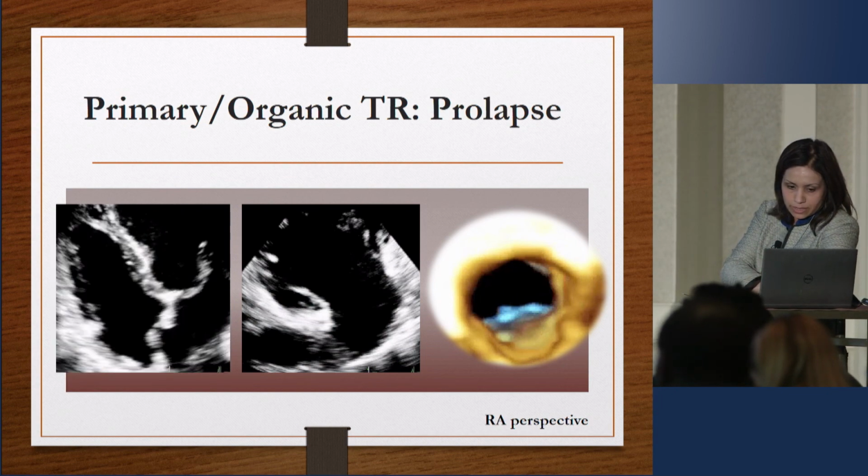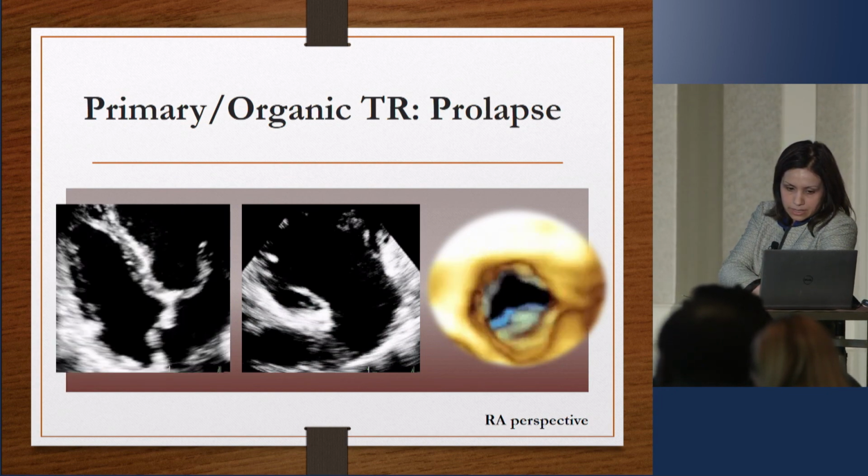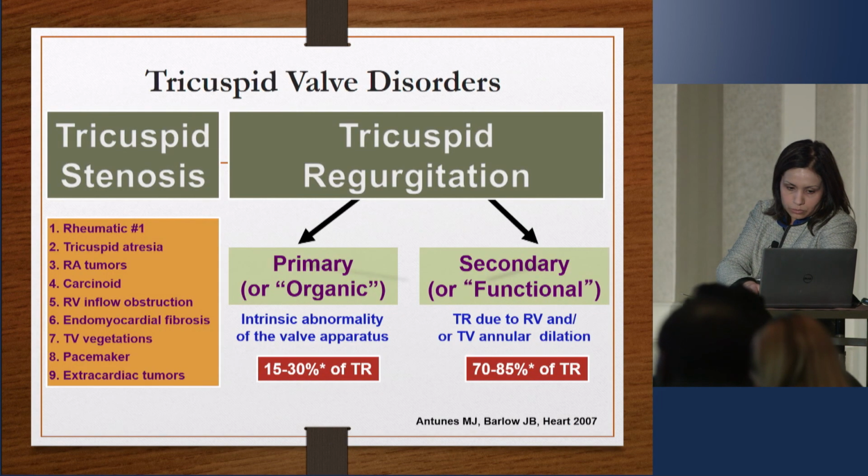This is an example of a case. Maybe I'll go back and forth, see if that works.